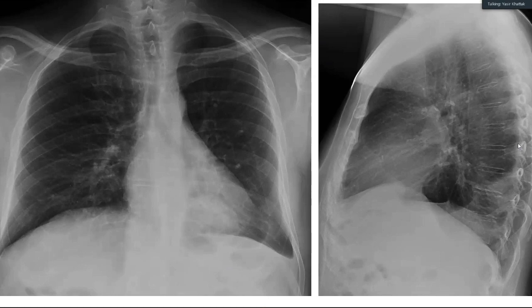So, irrespective of what the history is, I'd like you to again come up with the findings. The first important finding that you picked up is a retrocardiac opacity. Any other association that you see with the retrocardiac opacity? In that case you will have to come up with a differential list. So go on. What's your differential diagnosis, or any other finding that you see on this X-ray?